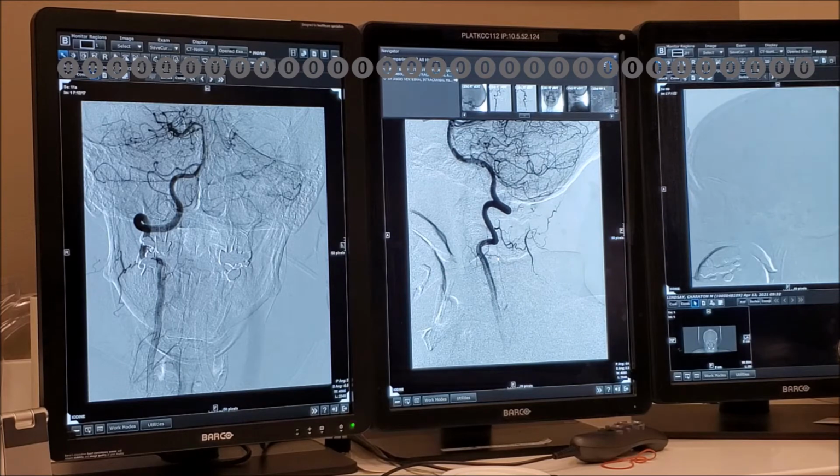Think of the anterior spinal artery as a collector, okay? And of course there are segments, but then it will come and give supply to one side of the cord and to the other side of the cord. The analogy is the lenticulostriate and thalamoperforators, all the vessels that follow the basilar artery, and this is the continuation of this artery. But you see, very nice. Tomoyoshi, you see the odontoid process here in this picture?